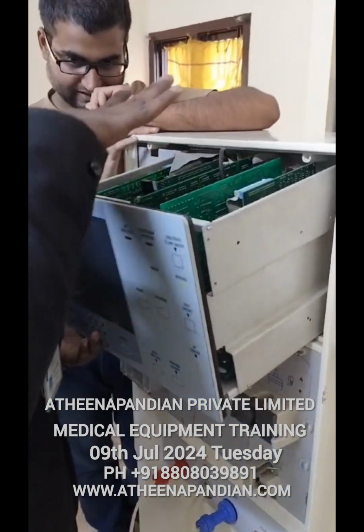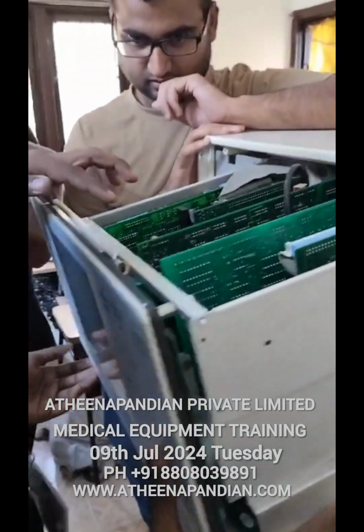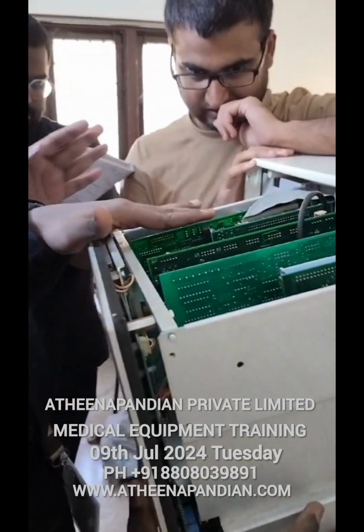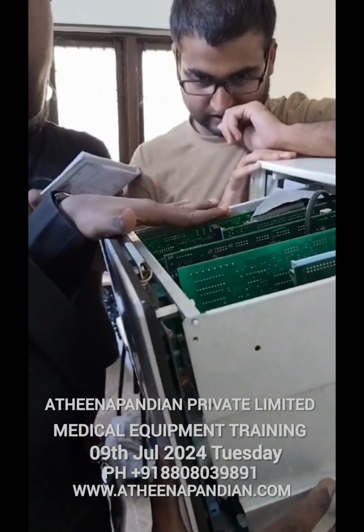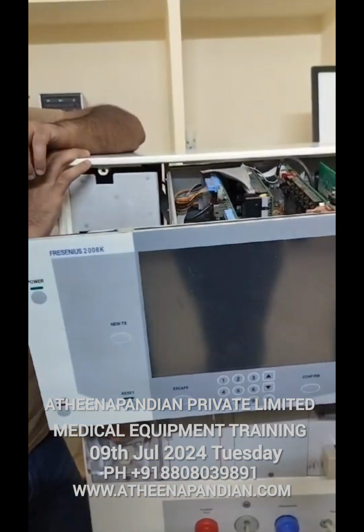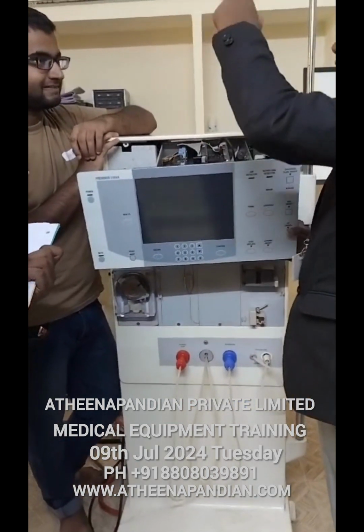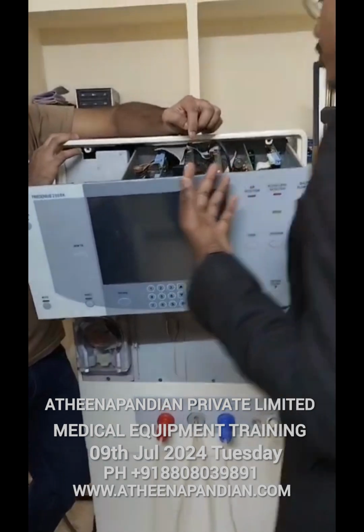Okay. Next we are going to move on. The board name is called function board. So this is called the power supply. This is basically made for electrical supply, fully having the electrical power supply, regulating the voltages, frequencies, and currents. But the actuator is the element to fix the things, to rectify each and every block. The actuator board is able to sense each and every current level and every speed level. Every thing is done by this actuator. Actuator means it is switching, one type of switching which just switches off.